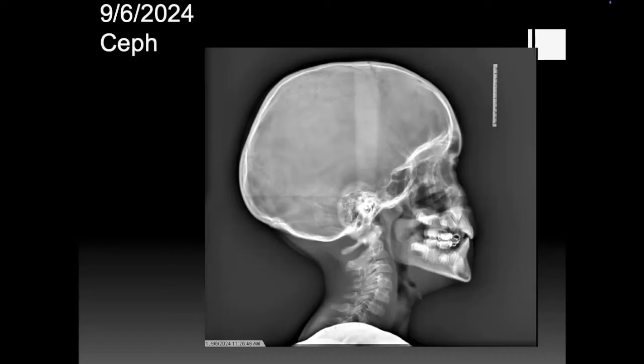From the mandibular plane angle, I would say dolicho. I would agree. Does anybody disagree? It's interesting. So you look at the mandibular plane angle, that's quite obtuse. You can see how the lower jaw itself does not look necessarily short, in my opinion. Or does it to you guys? Does it look like no?